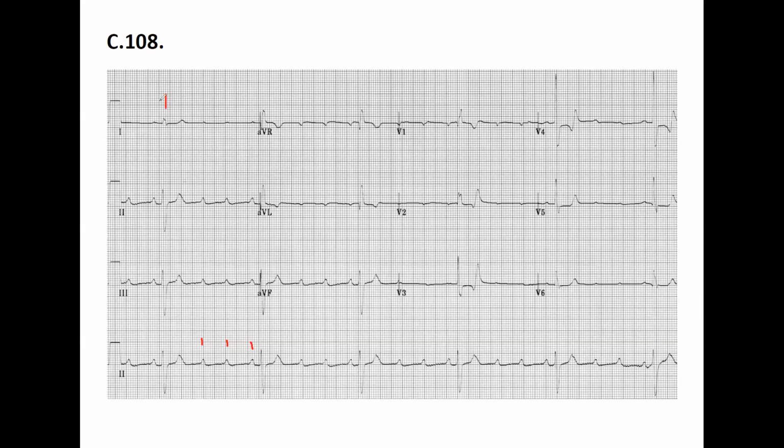I do not think so. Lead 1 is positive, that's fine. But AVF is? Negative, more negative. And lead number 2 is negative. What does it mean? Slight left deviation. Pathologic, not slight, because if I draw this hexaxial system, this is what you have to have by heart.